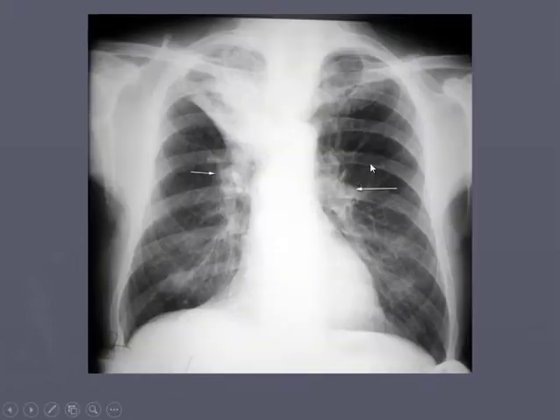Here's another X-ray with atelectasis. So remember, before I was talking to you about the pulmonary arteries, we should see one right down here, and it should make a nice 20-degree angle. You see that the pulmonary artery is up here, higher than the left, making about a 10-degree angle. So you can see that that's really shifted upwards. It should be down here. So when you're reading your X-ray with the ABCDEF method, you should have been clued in that something's going on at letter C, because this is being pulled up, and you have to say, well, why is it being pulled up? When you get to the F, to the field, you can see a dense mass up here.